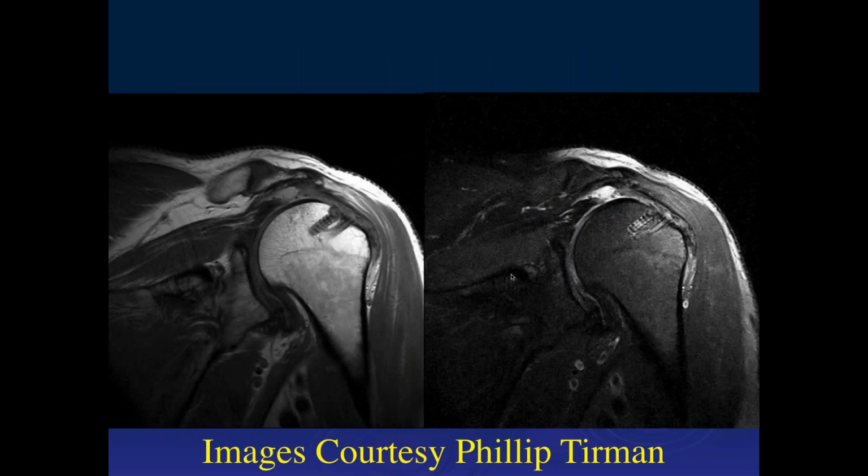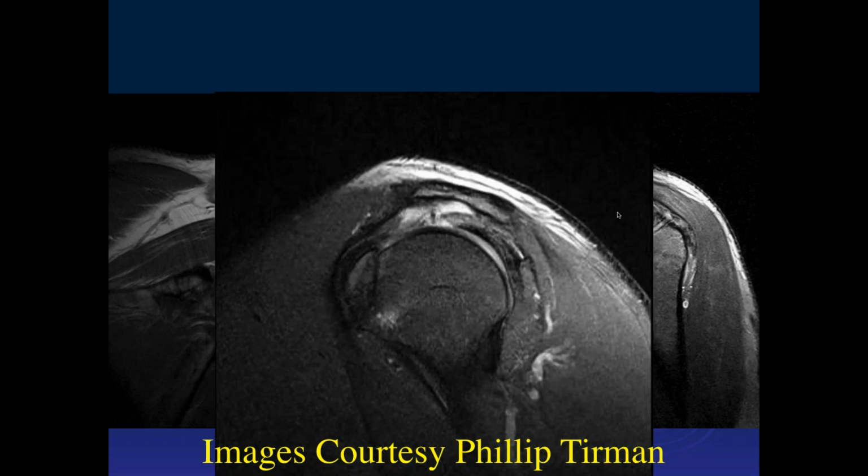So it looks like there's a full thickness tear of the supraspinatus. I see suture anchors. Yeah. So it's another tear with extravasation of fluid through the.